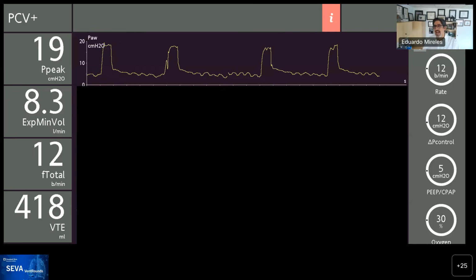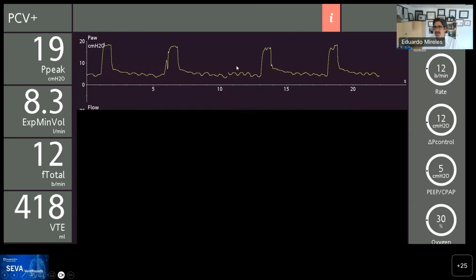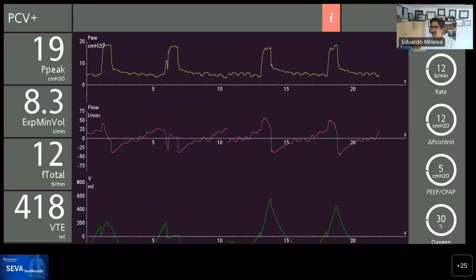All right, so let's do an analysis of this waveform. This is a good example, in my mind, of why, if you're controlling pressure, you have to go and look at the flow waveform. All righty. So here we are. Here's the waveform. I took out all the other settings that you saw on the screen so that we could see it a little bit more amplified.